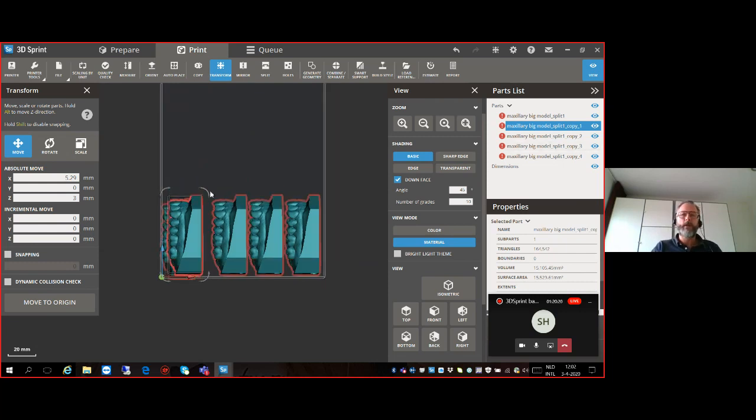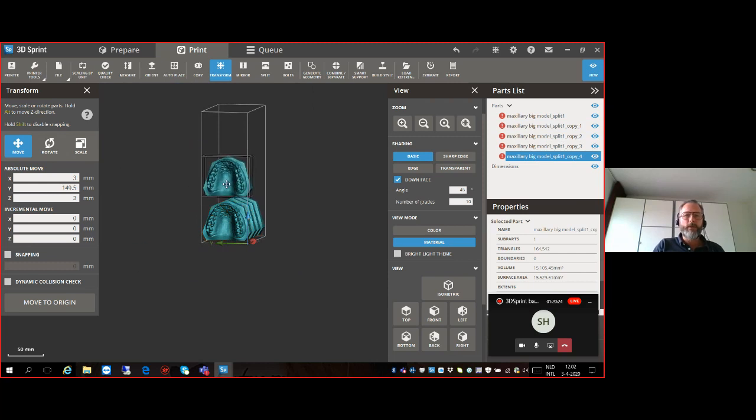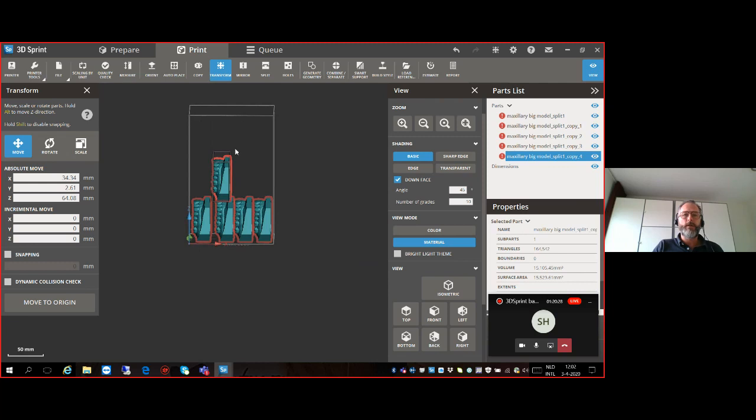It will stack them. That will be done automatically by the software until the total Z-axis is used, and therefore within this new software package, when it comes to orthodontic models, you can print up to 25. I've already seen our testers print 30 models in about 1.5 hours.